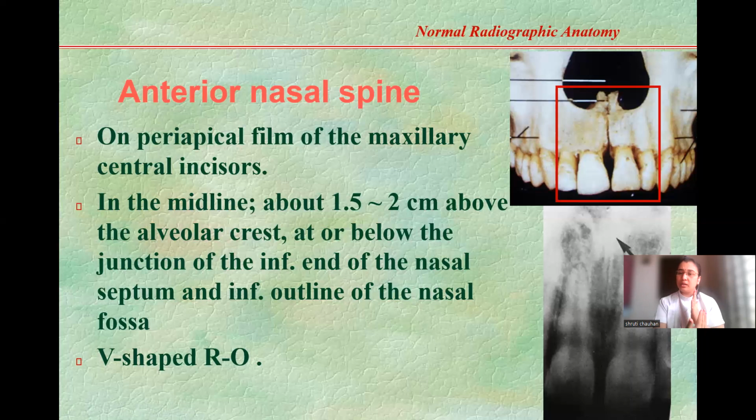It will look a little darker. Okay, remember, the thing which will stop more of the X-rays will look white, the thing which will let the X-rays pass will look black. So now what was it then? The anterior nasal spine, it is white. White means radio opaque. Okay, got it? No confusion. RO, radio opaque, white. It is a bone, extra bone, going to stop the X-rays.